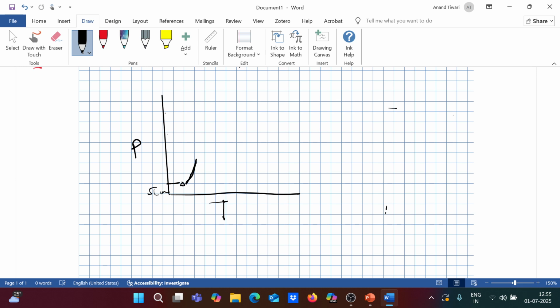The initial pressure rise will be because of the resistance in the airway, trachea, tube, bronchi. So this will be the initial airway resistance. Then there will be an exponential rise in pressure, that is the recruitment at different time constants of the alveoli, and you will reach the peak pressure. If you keep an inspiratory pause here, there is no flow, there is a slight drop in the pressure, and what you see is the plateau pressure here, and then there is the expiration to the baseline. This is the normal morphology of the pressure time curve.